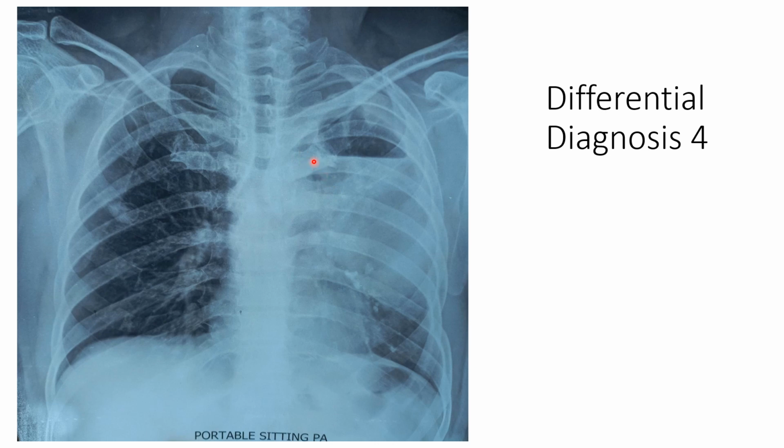So in this X-ray, you're seeing a straight line. It's almost from the medial to lateral, through and through. Above you have this dark area, right, and below it is a white area. Then you can call it hydropneumothorax. But now you have this lung here. So now it is not a hydropneumothorax, because if it had been a hydropneumothorax, the entire thing should have been filled with fluid, right? So in hydropneumothorax, above it is air and below it is fully fluid.